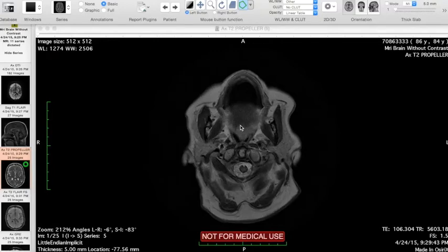My name is Remy Kessler, and I am one of Dr. Michael Levy's incoming medical students and a research fellow in the Department of Neurology at Johns Hopkins Hospital. In this video, I will demonstrate the method we developed for quantifying iron deposition on the surface of the brain for patients diagnosed with superficial siderosis.